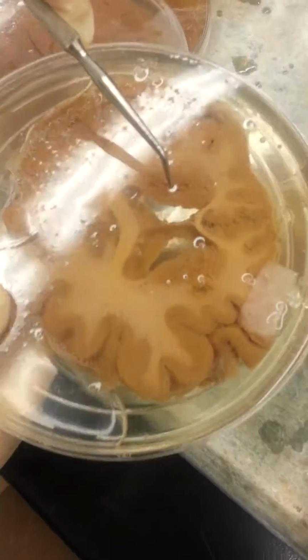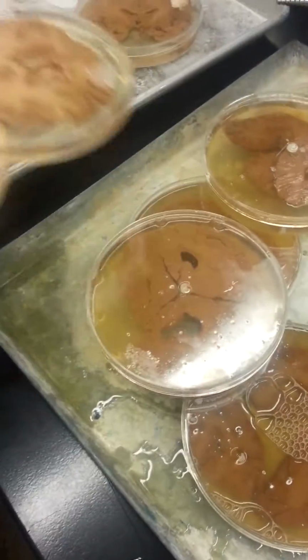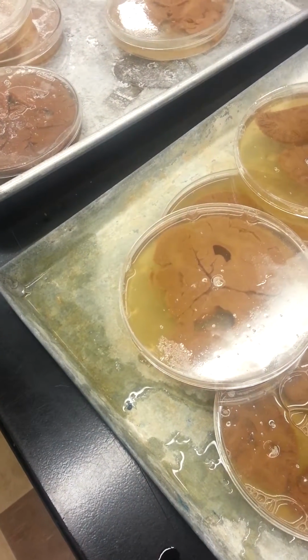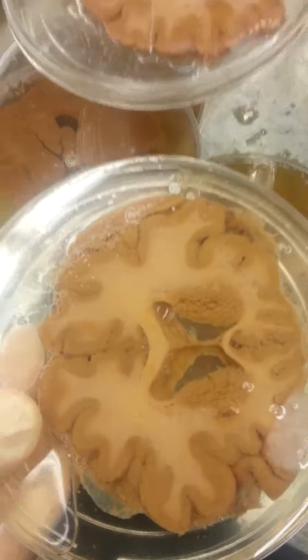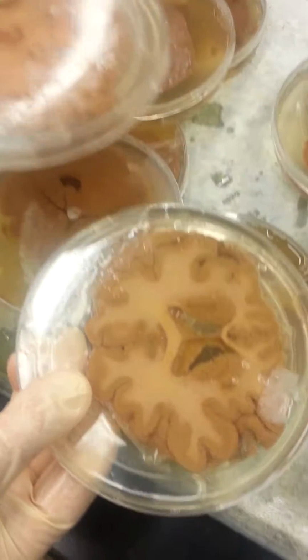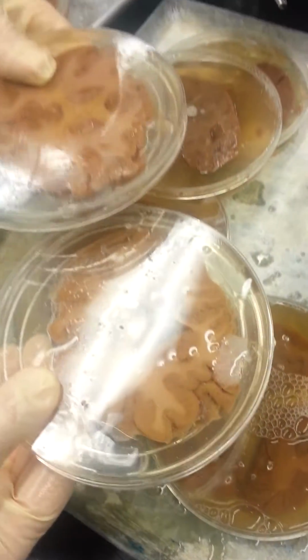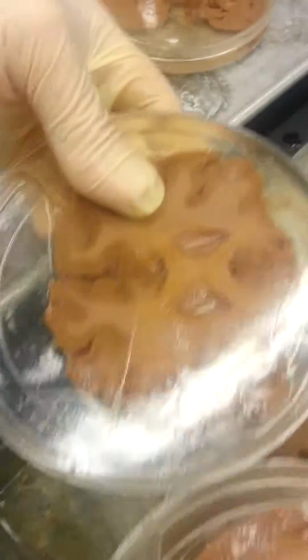The head of the caudate nucleus. You didn't see that in the previous one. Where is that? We didn't? No. Can we see them side by side? See, none of the basal nuclei show at all. Oh, yeah. We're too far anterior. But now you see the head of the caudate nucleus. That means more posterior. And that's one of the reasons there's less centrum semiovale, because now the basal nuclei are making their appearance and filling in part of the interior.